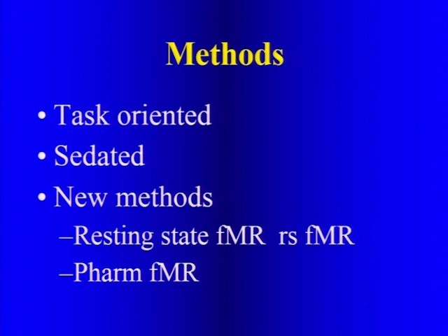So the methods we use are task-oriented, which I'll show first, and that's pretty much what we've done for the majority of the years. And we do this both in sedated and non-sedated patients, and then which is increasingly being written about and utilized, and we've started to use, is called resting state fMRI, and I'll show you some examples of that as well.